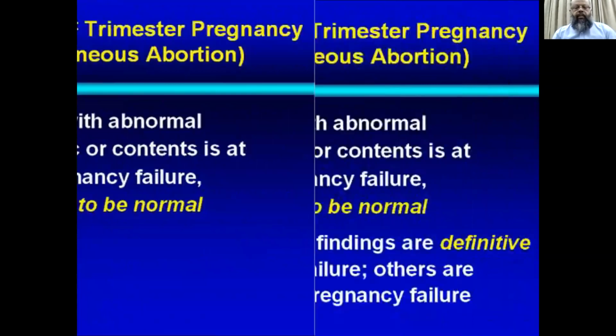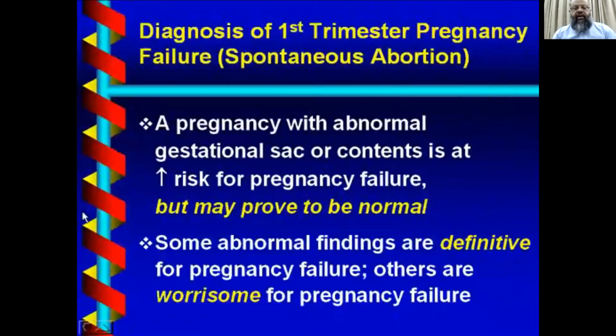Some abnormal findings are definitive for pregnancy failure. Others are worrisome for pregnancy failure. So there are some signs which indicate definitive pregnancy failure, whereas some create some doubts.